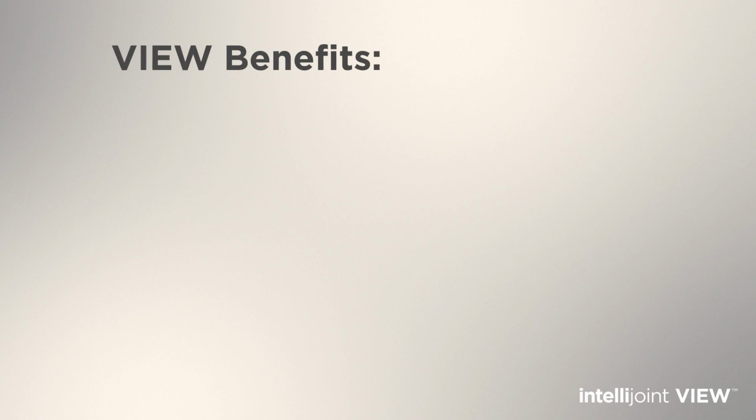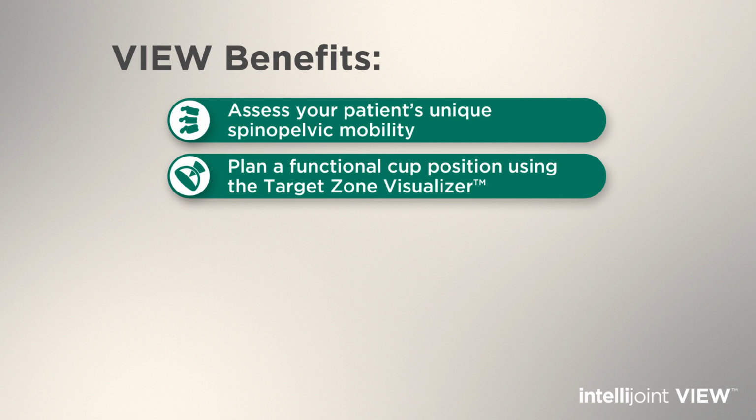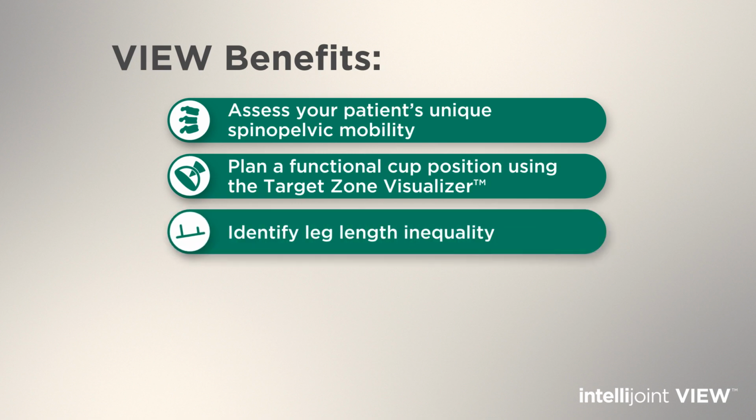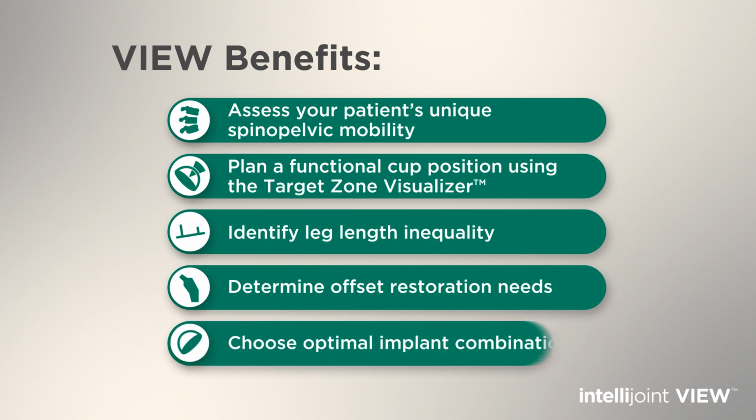Using VIEW, you can assess your patient's unique spinopelvic mobility, plan a functional cup position using the Target Zone Visualizer, identify leg length inequality, determine offset restoration needs, and choose optimal implant combination.